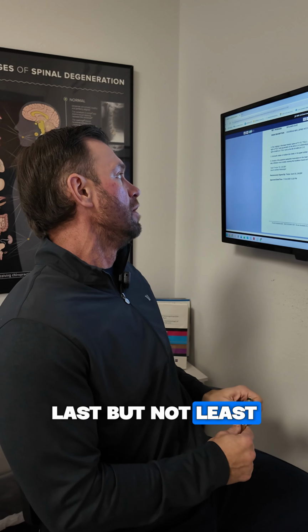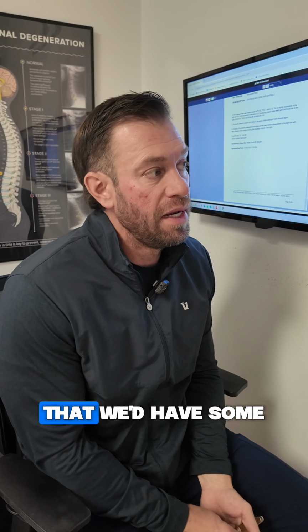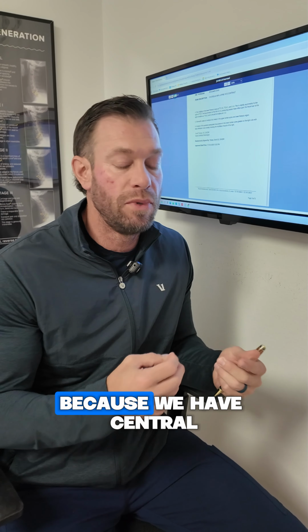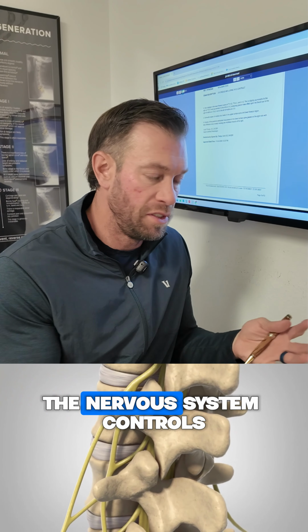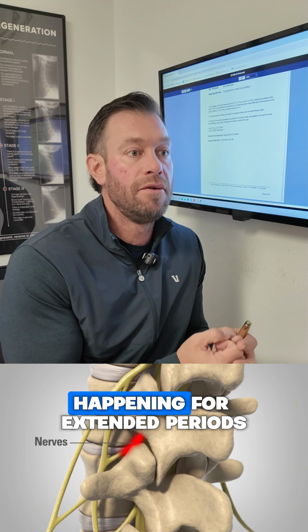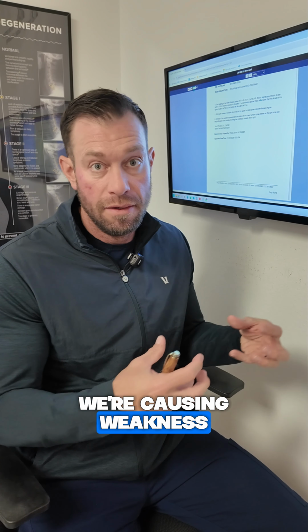Last but not least, we have atrophy of some of the posterior paraspinal musculature of the lower lumbar spine. Well, goodness, that makes a lot of sense that we'd have some atrophy in the muscle tissue if the joints are becoming weaker and degenerative, and we're having improper nerve flow because we have central and foraminal stenosis. How do muscles get their impulse control? How do they stay strong? The nervous system. The nervous system controls the muscular system. So if we have this compression of nerve roots happening for extended periods of time, what we will often see is there's some atrophy in the muscle tissue, which is detrimental because we're causing weakness, more and more weakness in that area.